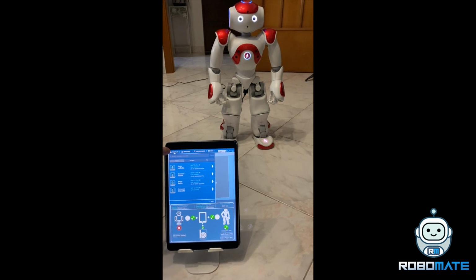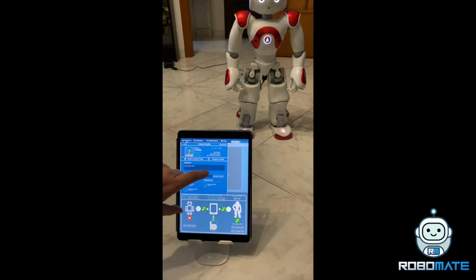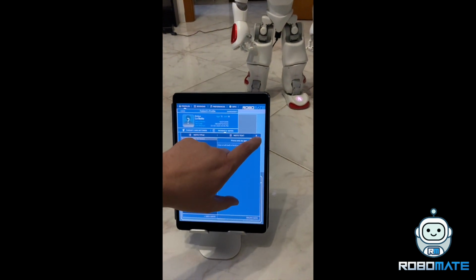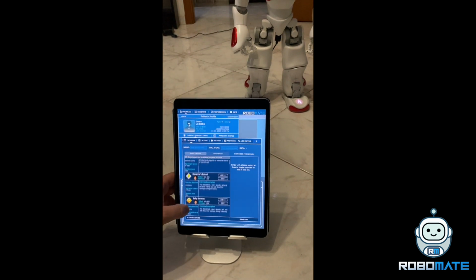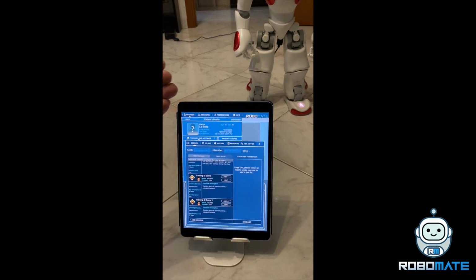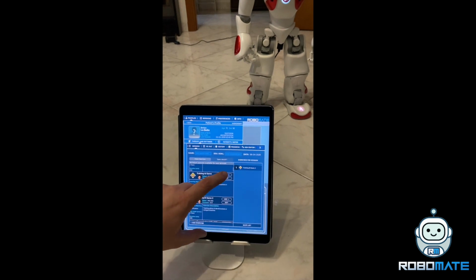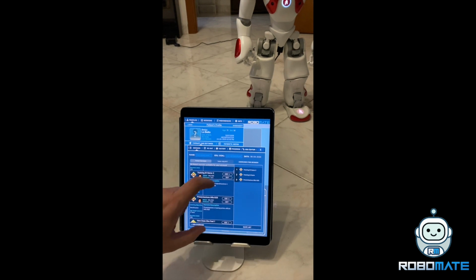We are here in the profiles area where we can, for example, add notes for the child, for the patients, create a new therapy based on the exercises that we have created before, or just downloaded to our software application, and add them directly to a playlist where we want to define a session for therapy.